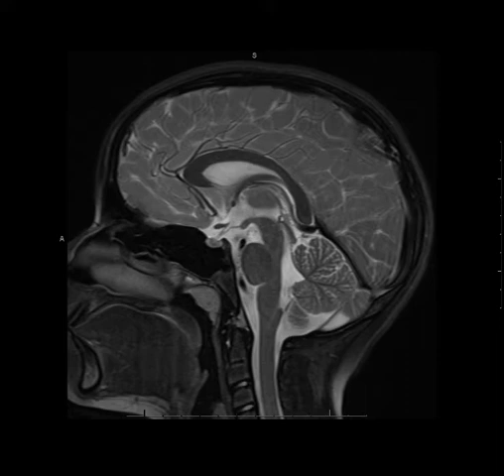The first thing I'd like to talk about is the third ventricle that you'll see outlined here in blue. If you want to think of it this way, fluid enters the third ventricle from above in the region of the foramina of Monro and then leaves posteriorly through the cerebral aqueduct. The cerebral aqueduct, also known as the aqueduct of Sylvius, is a channel through the posterior aspect of the midbrain that connects the posterior aspect of the third ventricle to the fourth ventricle.